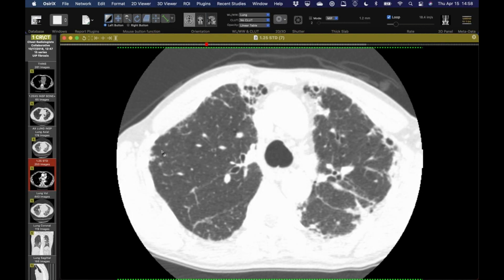Vasilios just texted me, any upper lobes looking PPFE-ish? I think it's just more conglomerate fibrosis. I think that's a great thought. I was wondering about that. But if I go back to the axials, I'm not so convinced there's the pleural component that we would expect with PPFE. I think it's just dense subpleural fibrosis. Most of this is just extrapleural fat. Yeah. But it's just an interesting observation, I think, that requires a little bit more investigation.